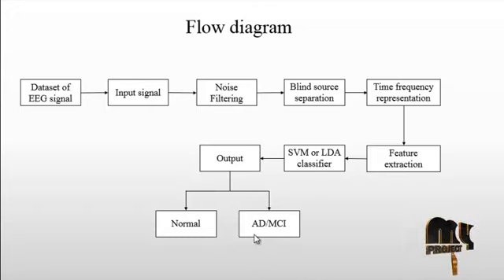So the classifier gives the output. Finally, it identifies whether the EEG signal is normal or abnormal. So the dataset is a must.